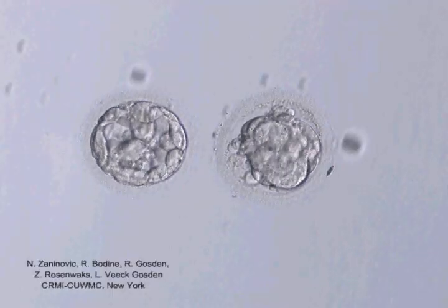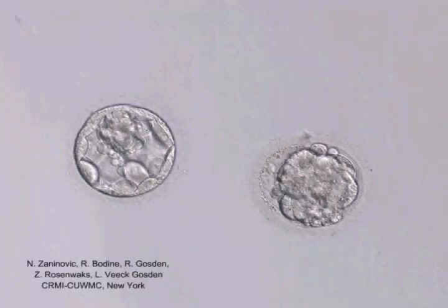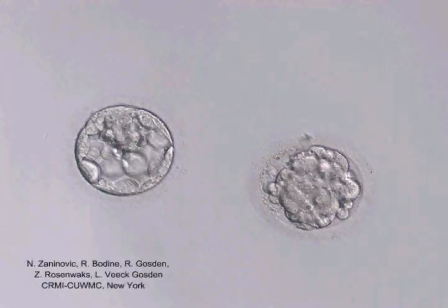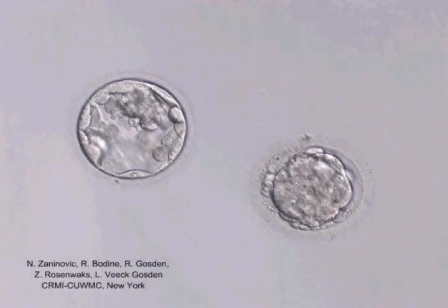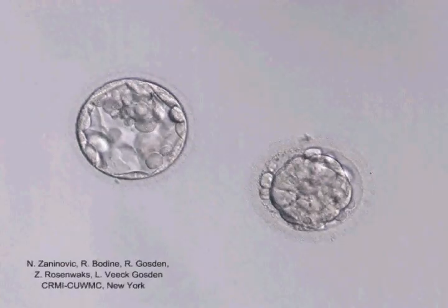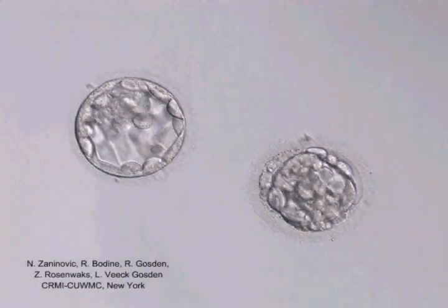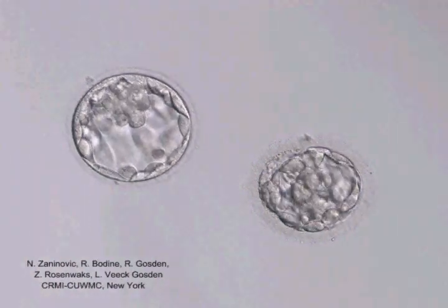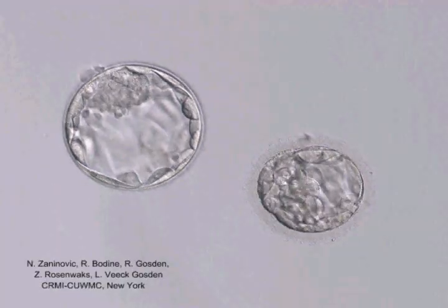Embryos start to cavitate on the 4th day when more than 16 cells are present. Pools of blastocelic fluid accumulate near the center of the embryo as a result of sodium-potassium ATPase activity in the polarized outer cells. The pools eventually coalesce into a single blastocelic space, and the embryo can now be called a blastocyst. The left embryo is developing faster than the one on the right.